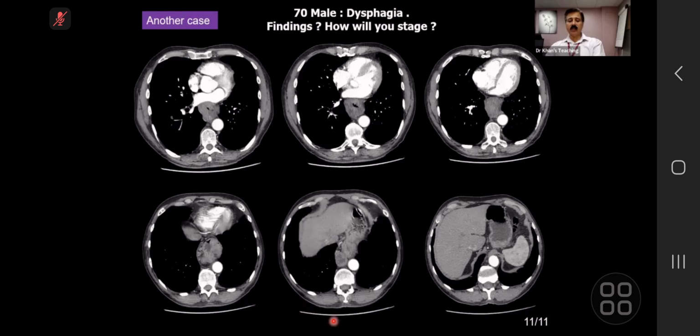Okay, candidate, last few films are left. Candidate 1, are you with us? I think 2 films are left, if I'm not wrong. Staging, what do you think?